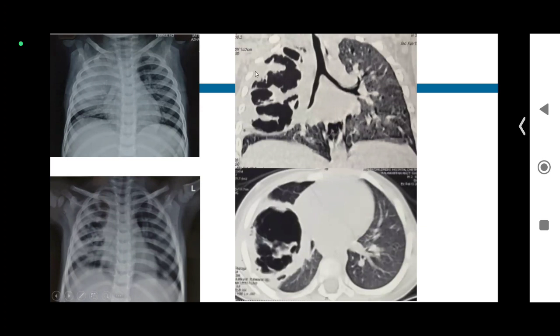Still, all these cavities are there within the lung parenchyma. If you see a picture like this, the diagnosis is nothing but necrotizing pneumonia. So what antibiotics cover MRSA or MSSA along with Streptococcus pneumoniae? Okay, you need to treat the child intensively, otherwise the child can have complications.